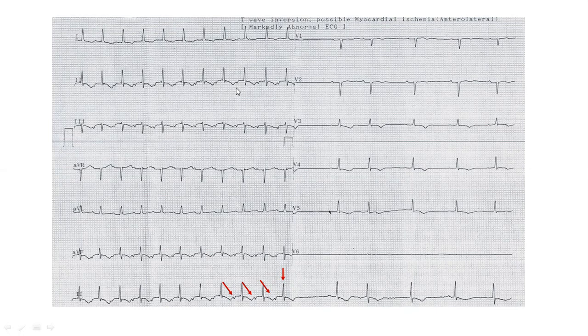This is negative in lead 2. This long RP cannot be sinus tachycardia. This is either AVRT, atypical, or an atrial tachycardia.